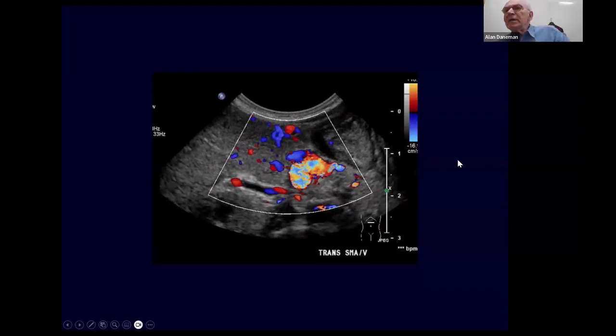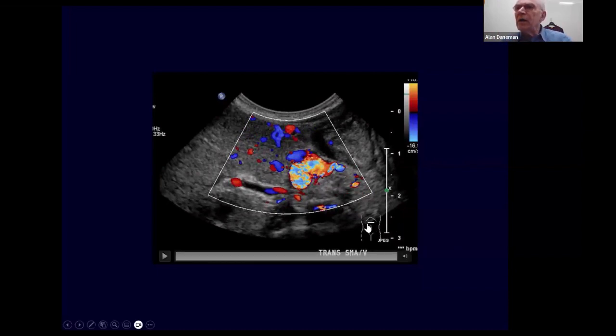So these are easy diagnoses because the mass, as I've shown, is just immediately deep to the abdominal wall, between the abdominal wall and the aorta and the IVC. It's usually in the midline, can sometimes be to the right or left, and it's in a transverse plane. So you want to diagnose it as shown over here with the transducer lying transversely across.